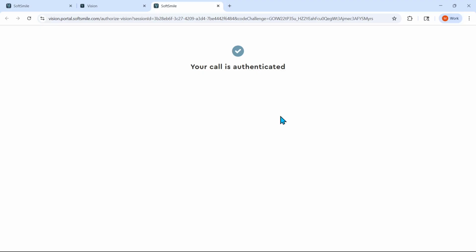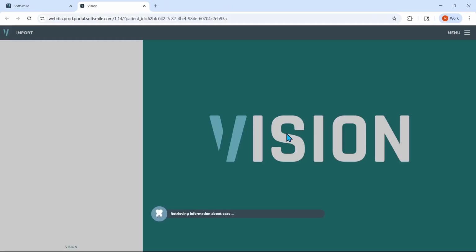And at that point, the case has had some type of modification, so you will add a few notes based on the changes that you are making, and then the case goes back to this setup for evaluation in case those changes have created additional aligners within the treatment plan. So we'll just wait for this to open.